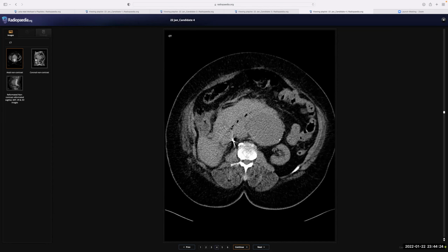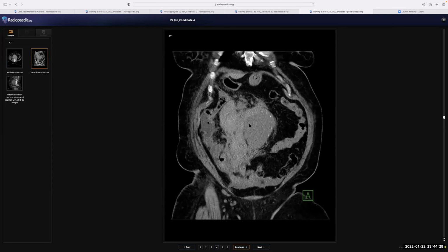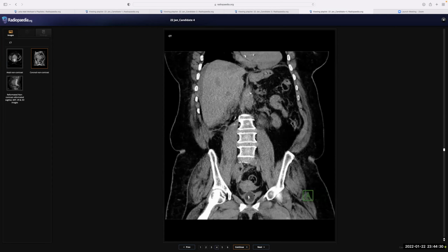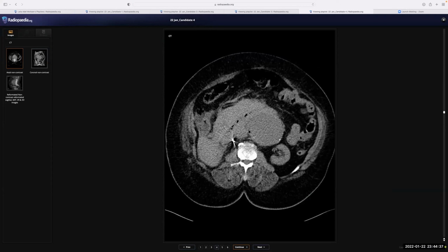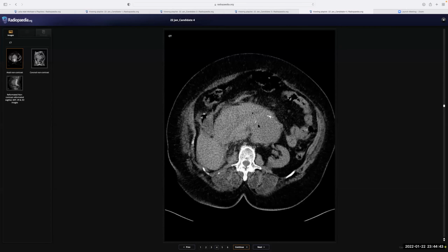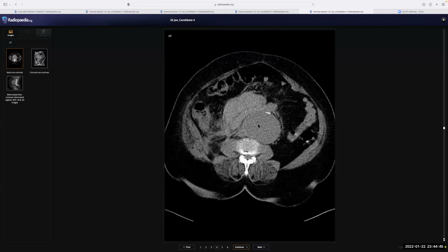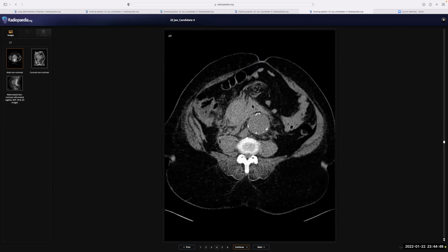Okay. This patient did not do the contrast study, but of course, while the patient is in your department, you will continue the scan and do the contrast study just to know the true extent and the true size of the aneurysm, because we cannot tell it here on the axial section. And then refer the patients as usual. And of course, you mentioned the retroperitoneal hemorrhage, the high density collection in the retroperitoneal. So these are all positive findings.